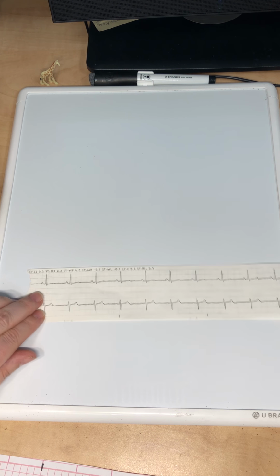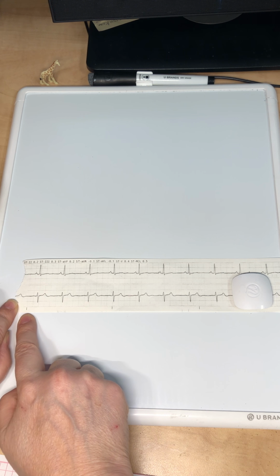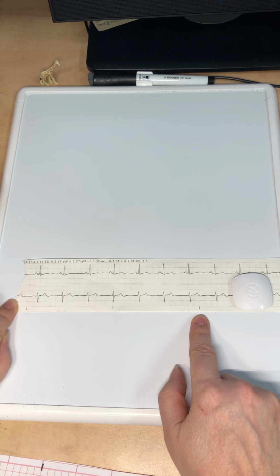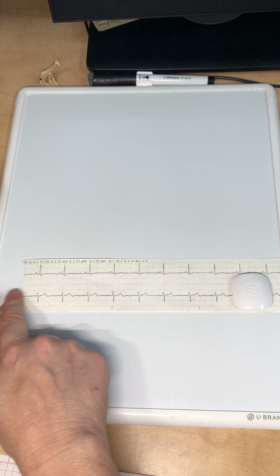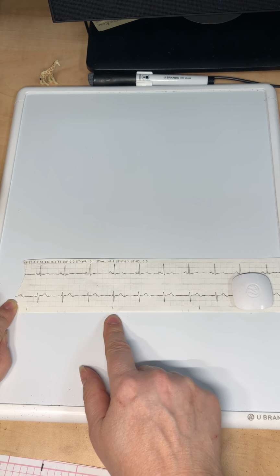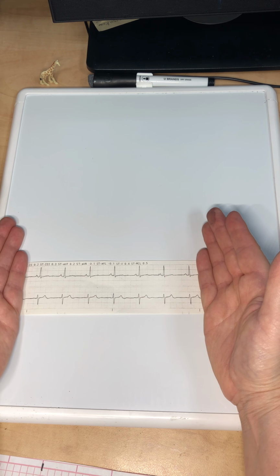I'm hoping that you can see this. So we have ticks at the bottom, and sometimes they're at the top. It just depends on the EKG paper, but most EKG paper has ticks on it, just timing out what's happening here. So we have the x-axis here is time, right? So from this tick to this tick, we have 3 seconds. And from this tick to this tick, we have 3 seconds. So this is what you would call a 6-second strip right here.